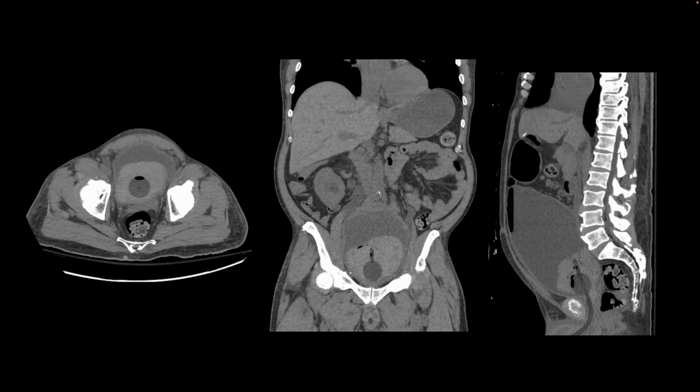Here's our next patient. They had hematuria, and on this CT of the abdomen and pelvis, which was acquired without contrast, on this axial image we find this hyperdensity in the bladder. This is also seen right there and right here. So there's a clot inside the urinary bladder, and this clot is in the inferior aspect, and the urinary bladder, the rest of it is distended. There is some non-dependent air, and the other interesting thing is that they've tried to place a Foley into the bladder, and the Foley is ending only inside the hematoma.